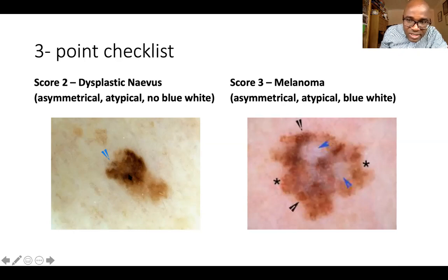So this is a dysplastic nevus, but difficult for anybody to differentiate without biopsy. Dysplastic nevus is basically a histological diagnosis. Clinically, you worry if you see this, you refer it for 2-week wait because it's very difficult clinically to distinguish between a melanoma or early melanoma.